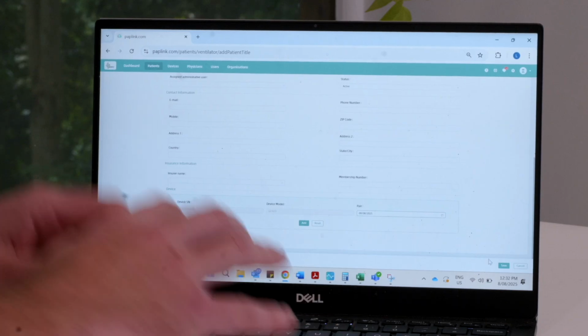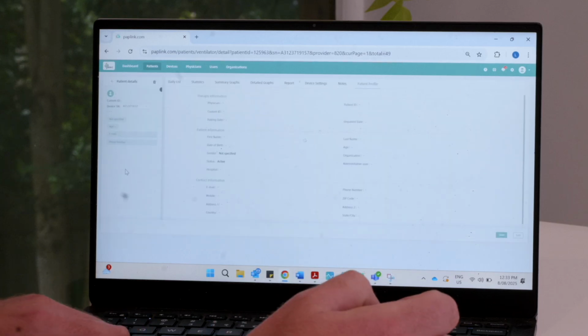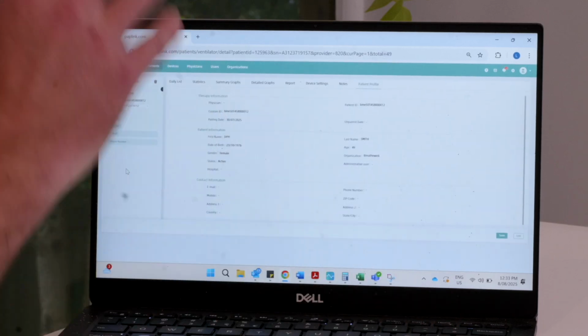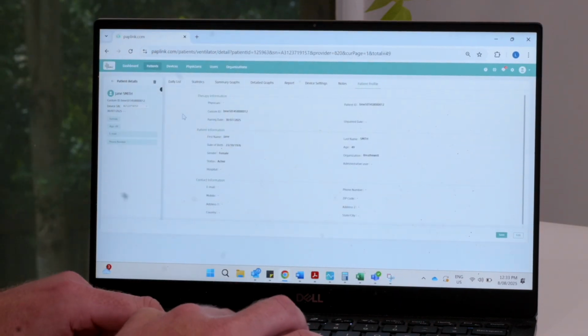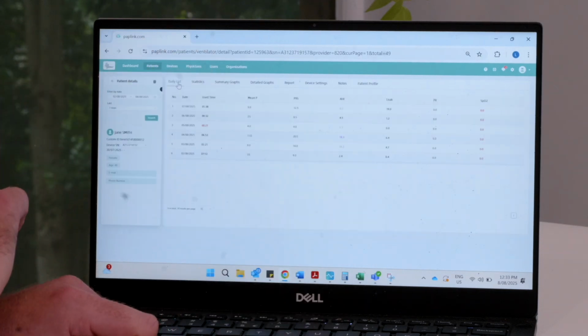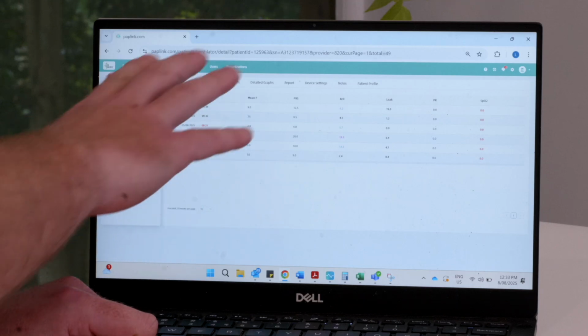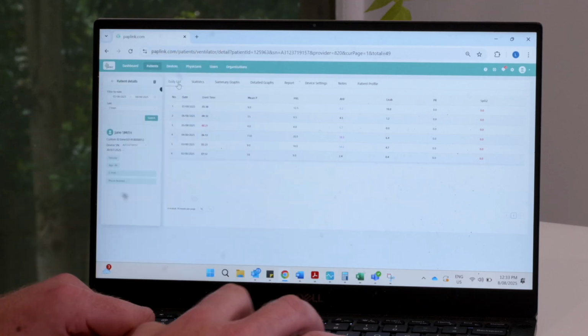When you click Save, that'll create that new patient's profile, and then data will start coming through either via Wi-Fi, if they connect to their home Wi-Fi, or automatically via 4G. Once your patient's profile has been created, if you click on their name, that'll take you into their profile, and then you can see information about themselves. The first page you'll see here is the daily list, and this shows you the raw statistical information.